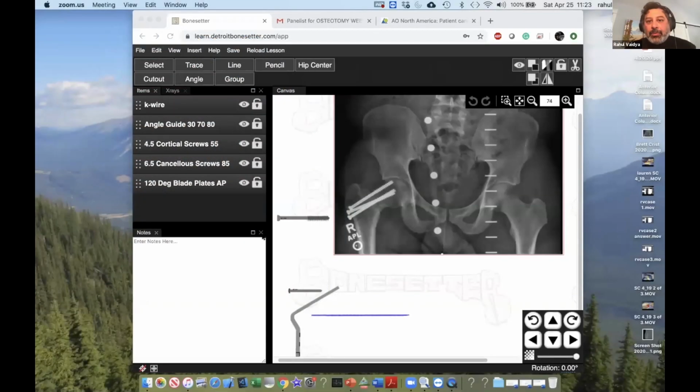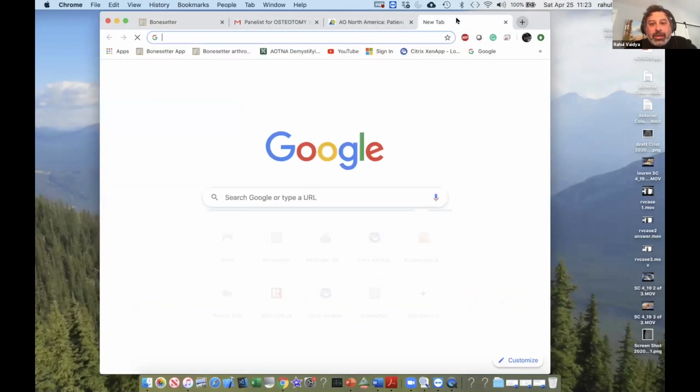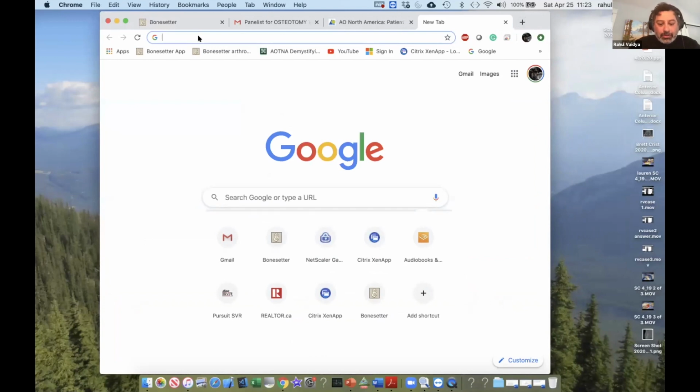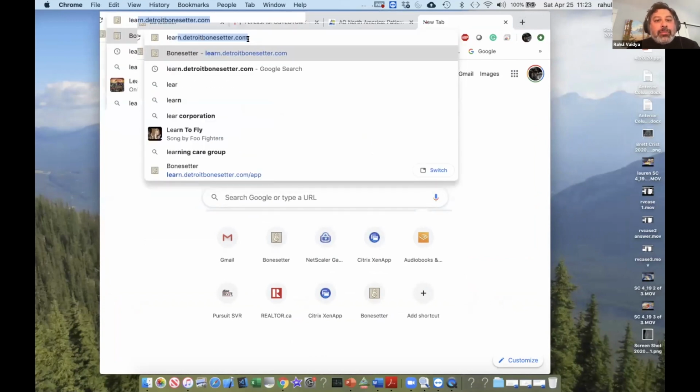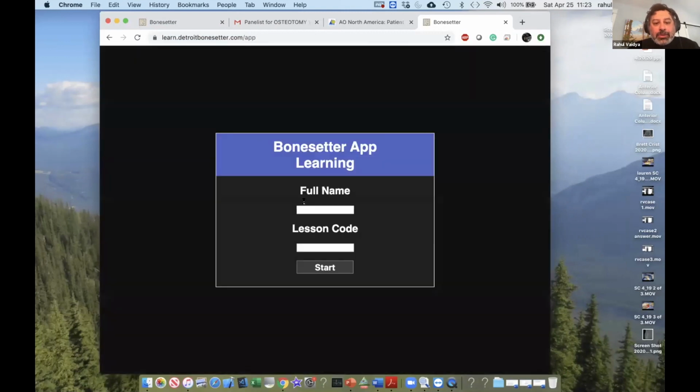Hope you can all hear me. We're going to do a little review again of the bonesetter for the exercise today. So I'm just going to show you how to get there again. You're going to go to learn.detroitbonesetter.com, put that in. This is what's going to come up.